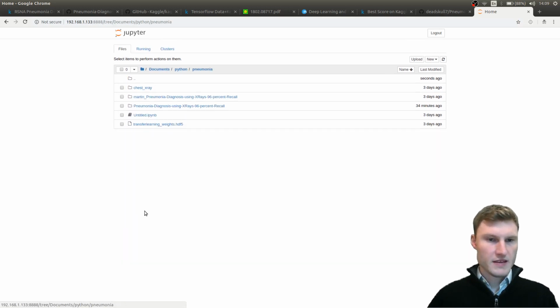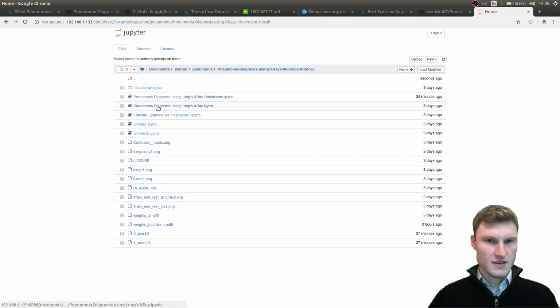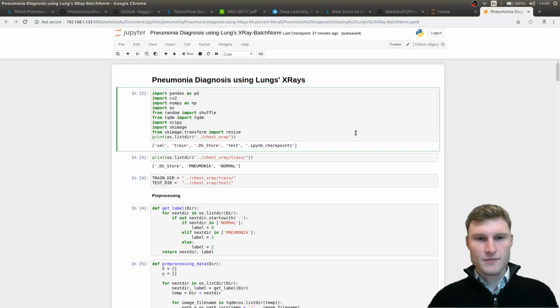because I already prepared my data and also the Jupyter Notebooks. It's not this one, it's pneumonia. Yeah, pneumonia. Here it is. So we're going to use this notebook. I have to say something about the data.